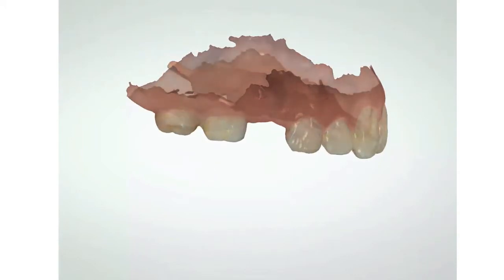Next, I want to go ahead and make my custom components. And we're going to go ahead and make a provisional, right? Design a provisional. So what do we do? What the laboratory will do is take that same implant position and import it into software that does prosthesis design. So there's the implant as if you took an impression after the surgery was done. Also there is the diagnostic wax up. They select the component that they want to utilize.